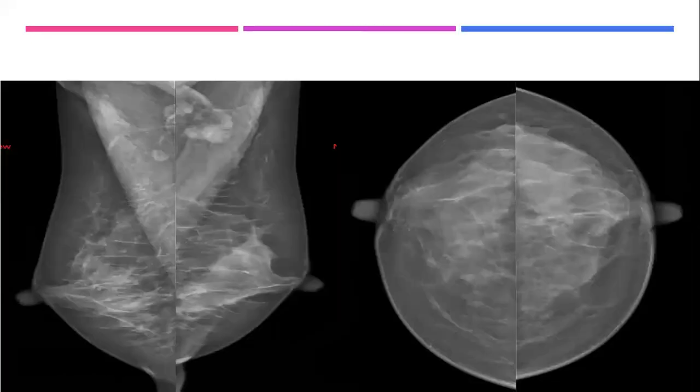So they had done the mammography and rediscussed the patient, and the ultrasound and mammography at that time were reported as normal, because really the findings are subtle. And if you look at the lymph node, it has abundant fat, but still it was metastatic.